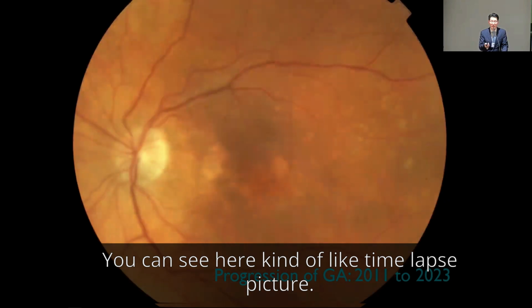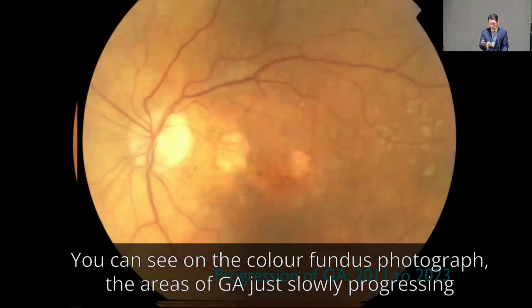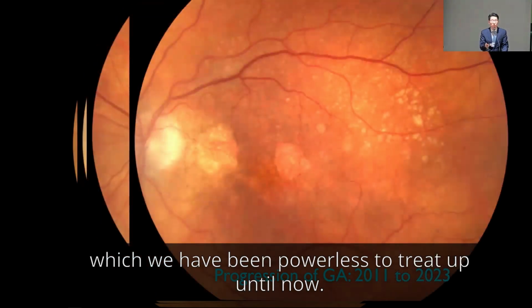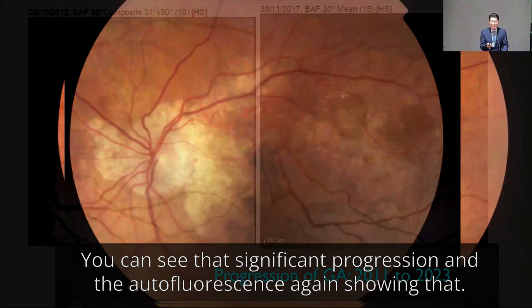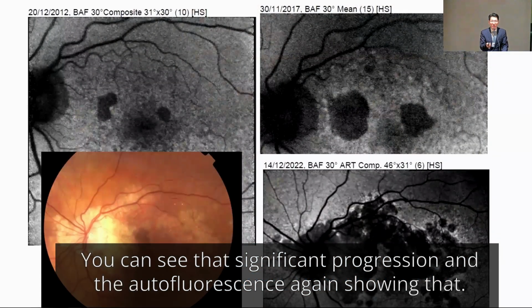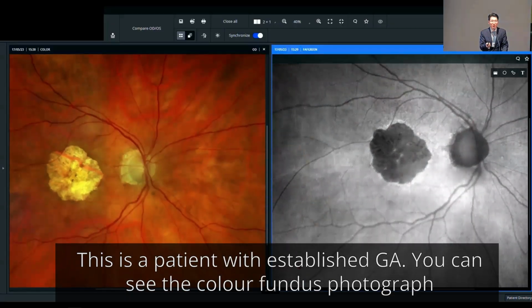You can see here, sort of like a time-lapse picture, on a color fundus photograph, the areas of GA just slowly progressing, which we have been powerless to treat up until now. So you can see that significant progression, and the autofluorescence again showing that. So this is a patient with established GA.